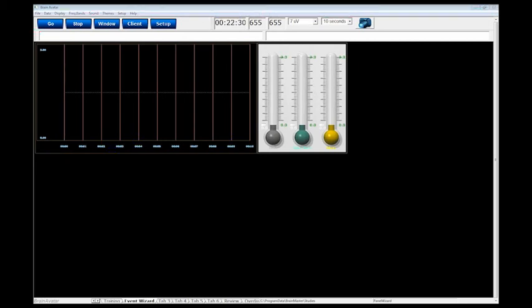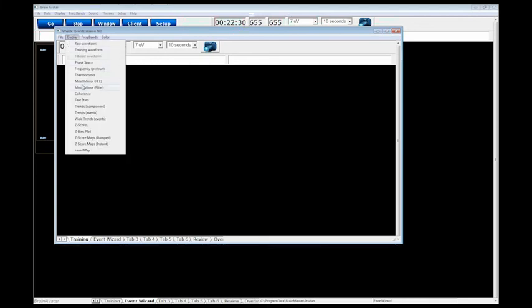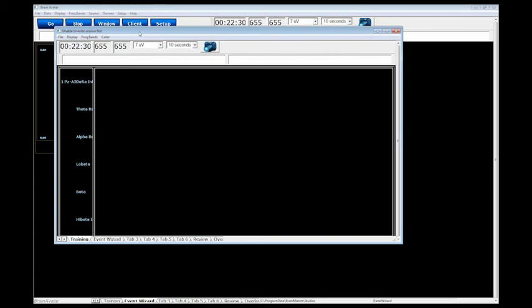Hi, Rob. It's Corey Feinberg. Can you hear me? Yes, I can. I have a question. Like most people, I probably use a separate monitor for our clients. Is there any way to put one tab on their screen, and keep another tab on your screen? At this very moment, no. What I can tell you is that there is the client button located right up here. What the client is looking at is not as functional as what we're looking at here. What I mean by that is I can't go through and design things. But if I go to this tab and I choose displays, and for example I have them look at their training waveform, it's going to do that.